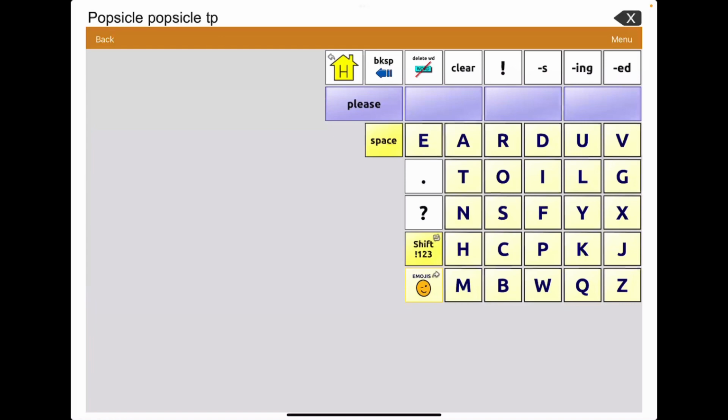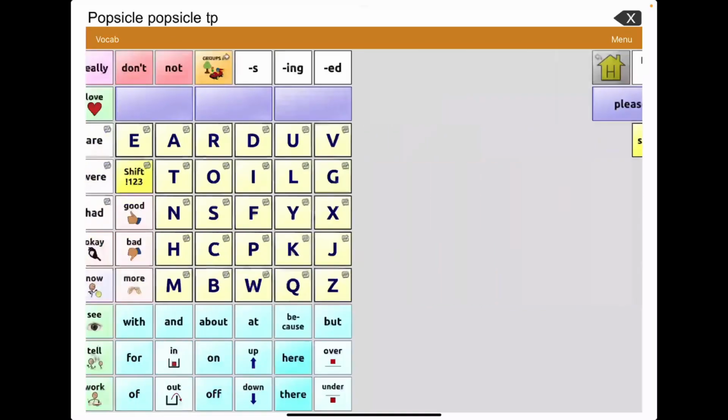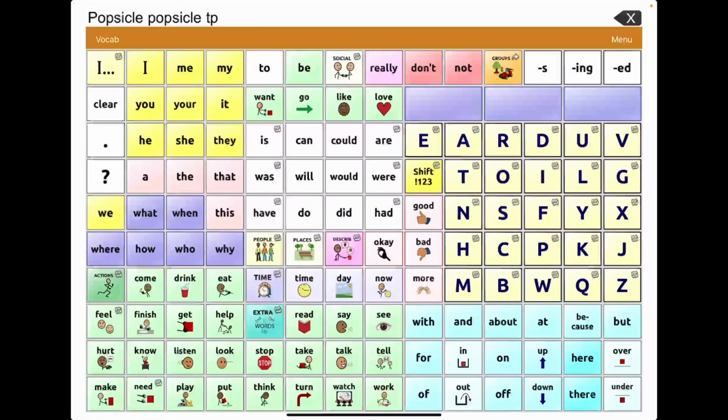You can also, of course, spell words out that you might be trying to spell. And it's okay if those words are in the device if you don't know where they are and you just want to spell them that way. Some people don't have that skill, or for some people, if you were switch scanning, it would take too long. So it's better to know where the actual word is, because that reduces the time that it takes for you to construct your message. But it all is dependent on the individual user.